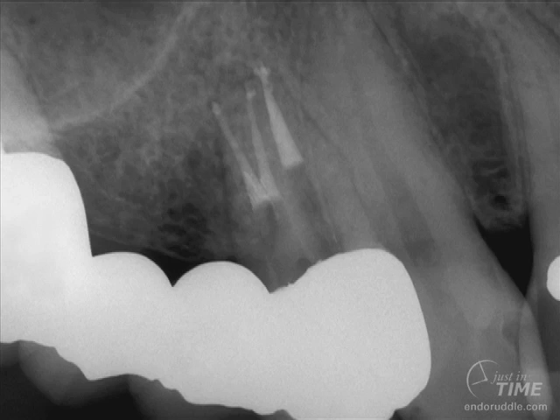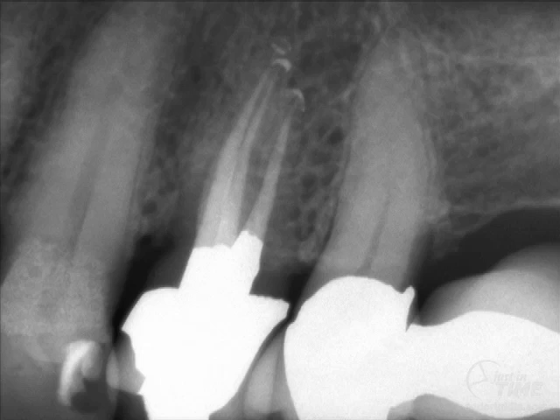Maxillary bicuspid, this one's carrying a 4-unit bridge. We need to have all those 6 steps that I've continuously identified as comprising start to finish endodontics perfectly managed. And when they're well managed, we can get predictably successful outcomes. Now I know some of you from time to time email me and you express surprise because you're in a maxillary bicuspid that has molar anatomy.